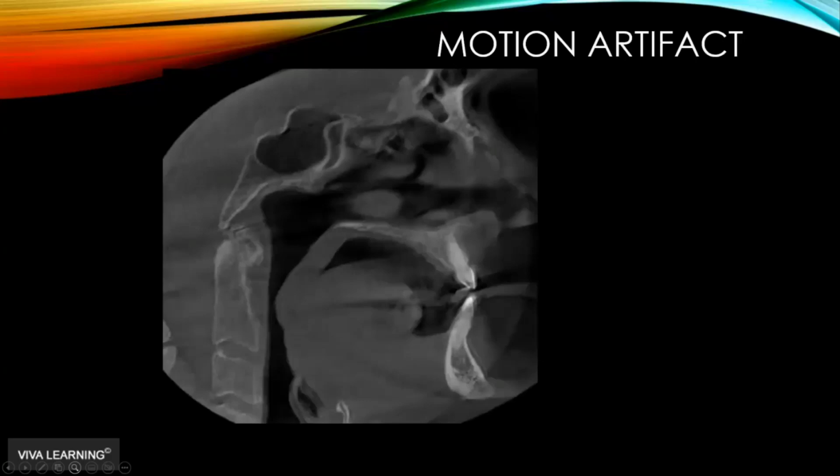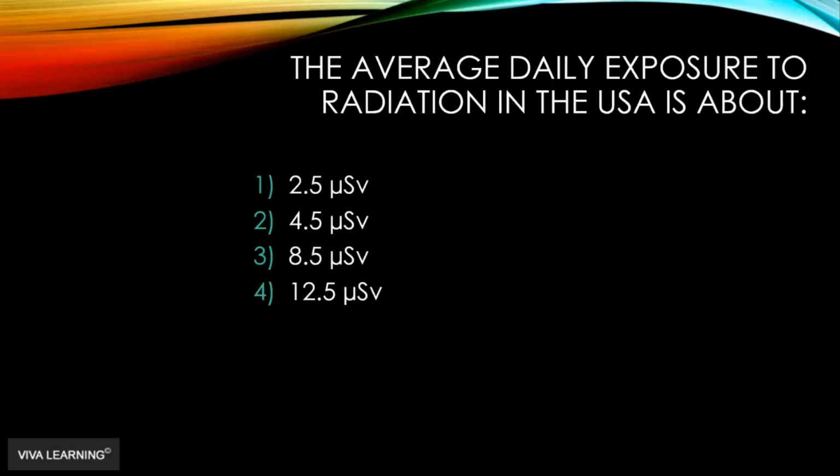So in this particular image, if you look at the cervical spine, you can see that there's like two layers, particularly along C2. And if you look anteriorly, you'll see what looks like a pseudo periosteal reaction. That means something completely different when I'm trying to interpret pathology, but this is just because there was motion in this particular scan.